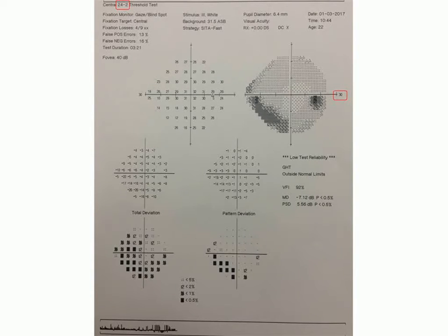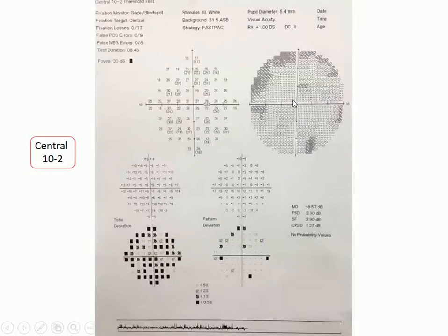Now, sometimes we tend to focus even more closely to fixation, and that brings us to a test called the 10-2, which focuses only on the central 10 degrees each way from fixation. And here's an example of a 10-2 visual field. We can see up here the title is Central 10-2. And here, these marks no longer correspond to 10 degrees each. The sum of them corresponds to 10 degrees. And we have this circle here that's testing that area. This would be relevant when we suspect from what the patient is complaining of that their problem is actually very, very close to fixation.